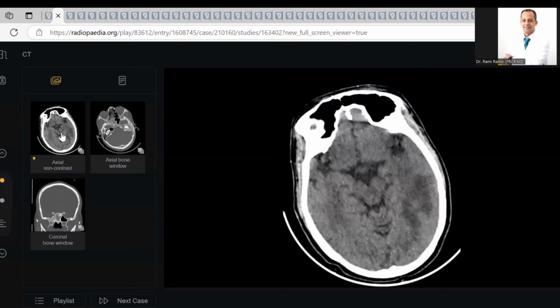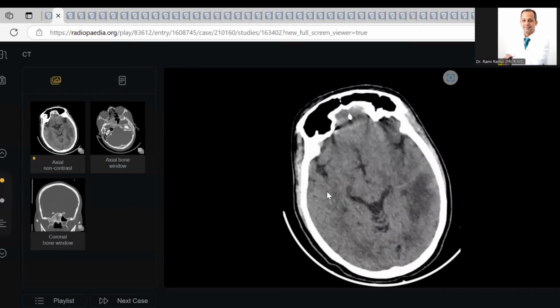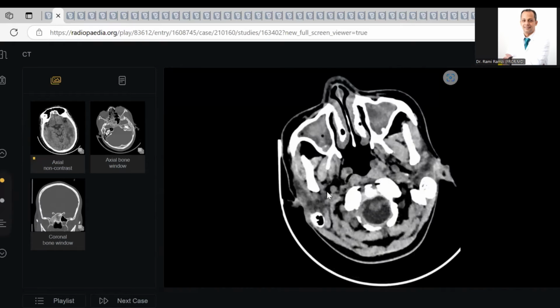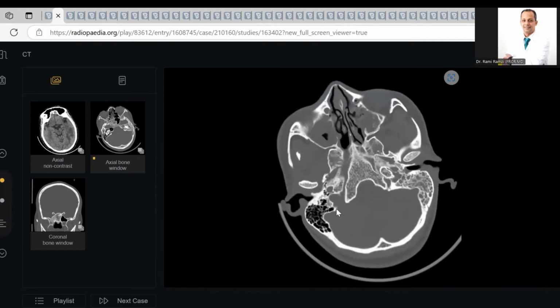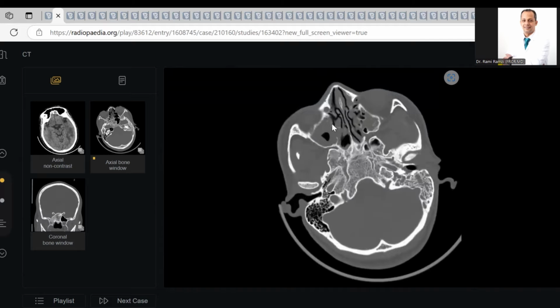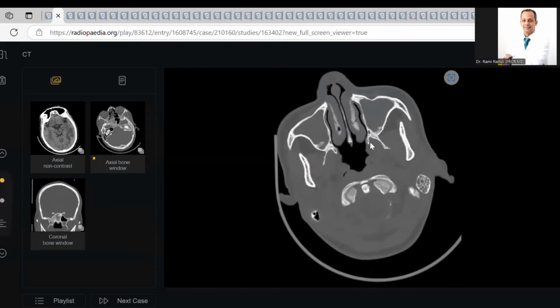You look here, okay, and you start very well. And then you ask for post contrast. No, this is CT. Ask first for bone window. Why? Because here, hyperdensity in the sinuses, you must suspect a fungal sinusitis. When you look here, this is one mistake you didn't mention, despite I went and came many times, and you didn't pick up. There is some disruption here. This is invasive sinusitis, my colleagues. Very critical point.